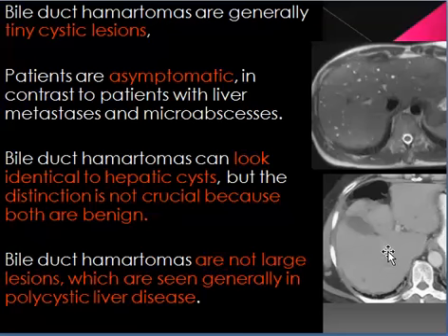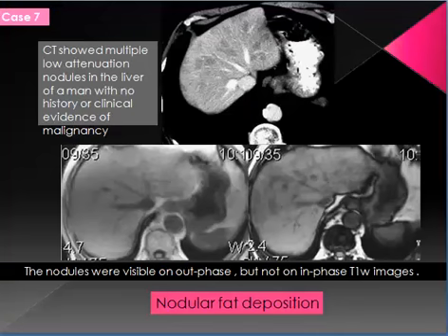In polycystic disease, we have larger cysts, more than 1 centimeter, and usually a limited number of about 10 or more, as in Caroli. But here in multiple hamartomas of the bile duct, they are miliary, scattered, and small, very small, less than 1 centimeter.